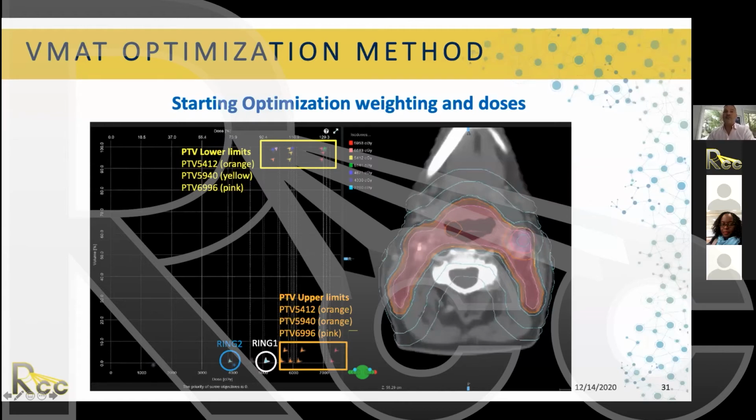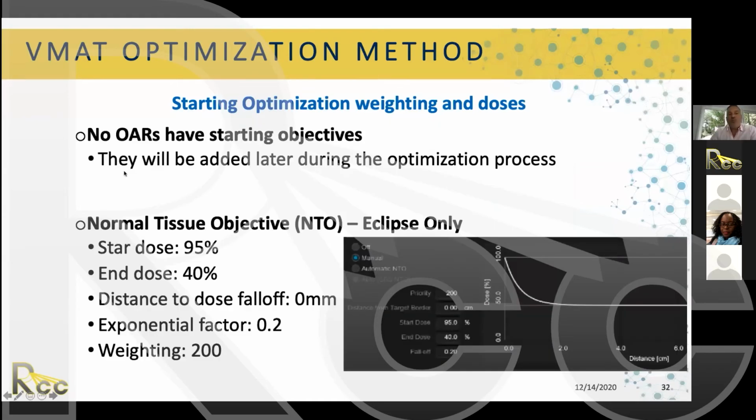And also I said that we're gonna add the two rings. In this case, we have two rings. See, we have the one in cyan color here, the first ring, and that's gonna be the first constraint we put. And then if you have another ring, you're gonna put it from the beginning. So basically, this is how you start.